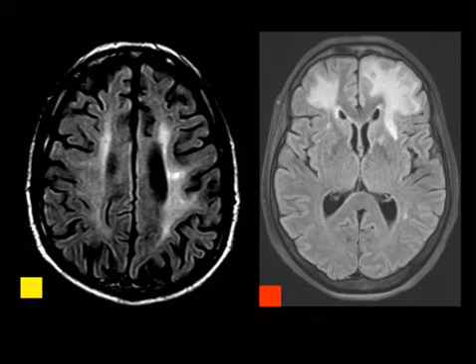So these are two different people, yellow and red. Both of them are immunocompromised, and I'm showing you FLAIR brain MR images. Let's just review real fast how I knew that. So we can see that the CSF is dark, so it's a T1 maybe. It's not a T2. But if it's T1, white matter should be white, and it's not, so it's FLAIR. T1 and FLAIR are the ones that you could get mixed up if you're not paying attention, because you just see dark CSF. But remember, white matter should be white, so that's FLAIR.